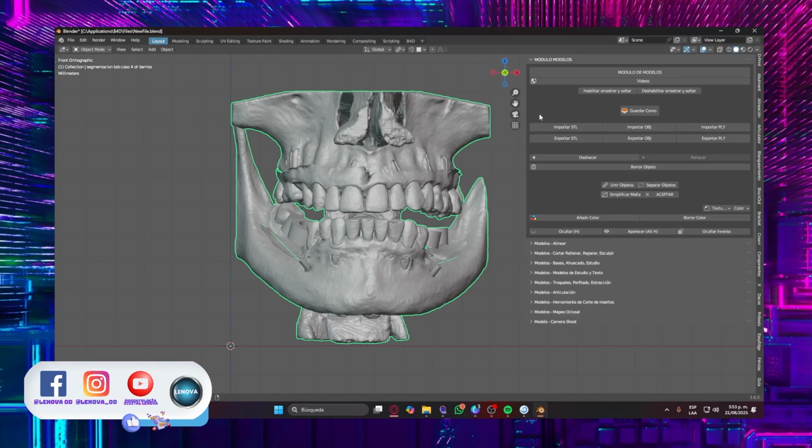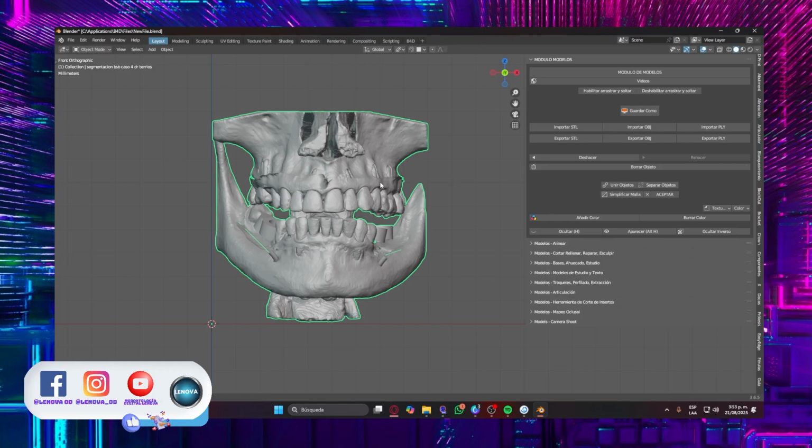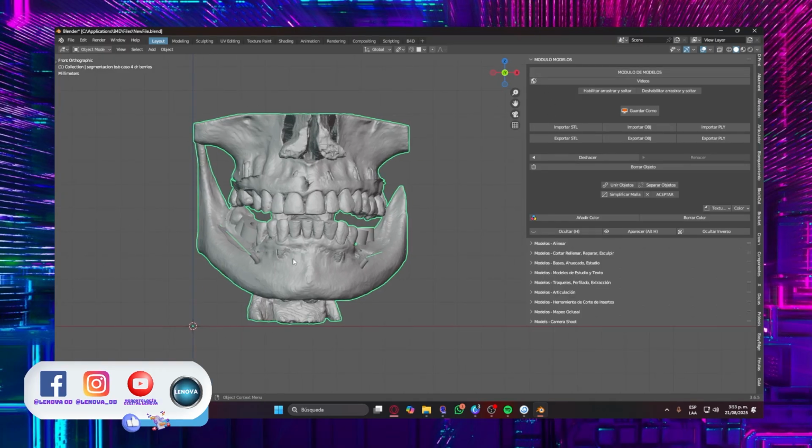Honestly, that's like having a window to all your private information on the computer, right? I mean, the crack has a very high price beyond other private information, okay? So what do I do here? It's very simple. You are going to select here separate elements.